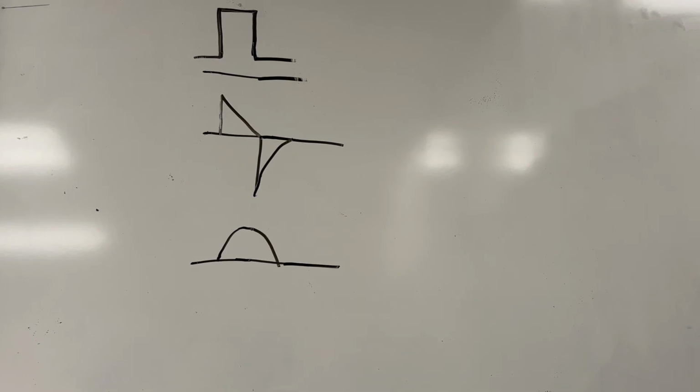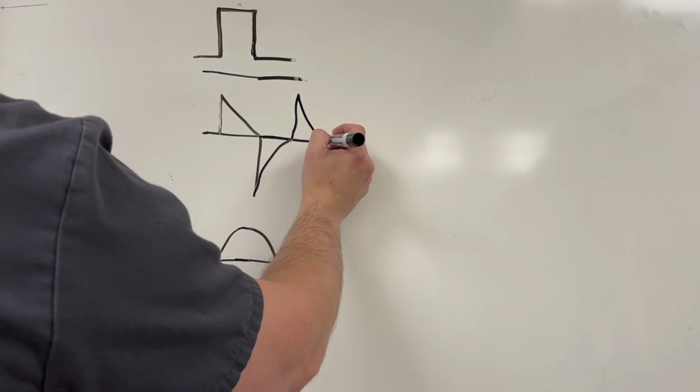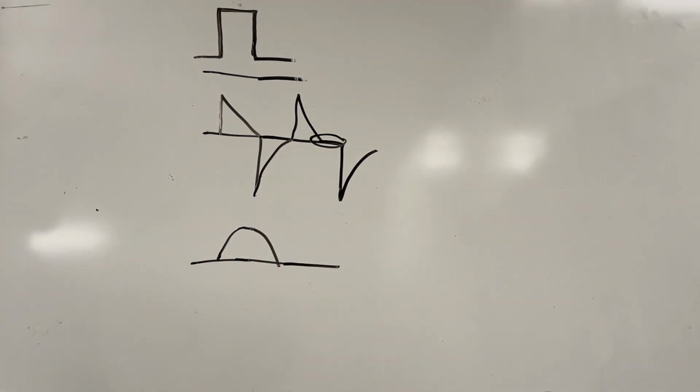Next, we're going to talk about what it looks like if your inspiratory phase is too long. Earlier in this video, we've talked about inspiratory cycle off for your spontaneous breaths. We've talked about some I-time things for your mandatory breaths. We've even talked about what it looks like on your flow waveform if your I-time is set too long, where it hits zero flow and then goes back up and has this breath hold. But there's something else that can tell us if it's affecting your patient.